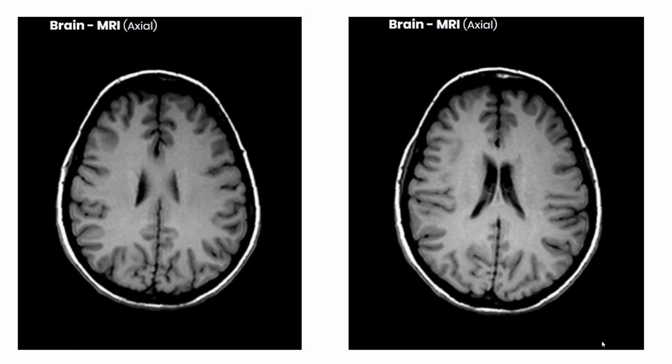Looking at the axial images from e-anatomy, do take a look at the two different brains in e-anatomy. There's one set that you can go through all three different planes and it has much better detail, and then there's another set that only has the axial images, and these axial images are much thicker, so it makes the brain almost look just a little bit blurry, but sometimes it's nice to see the images in a little bit different version, so I wanted to show you a little bit of each. So we're going to take a look at these images that are a little bit thicker slices right now.